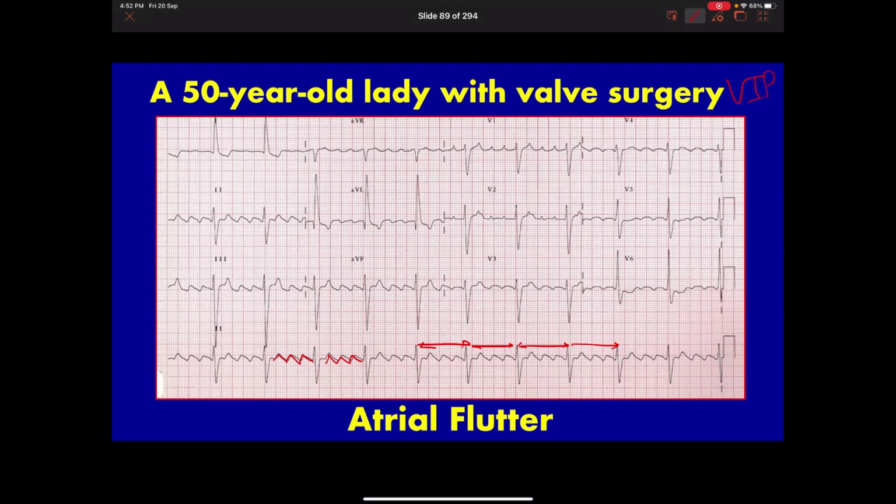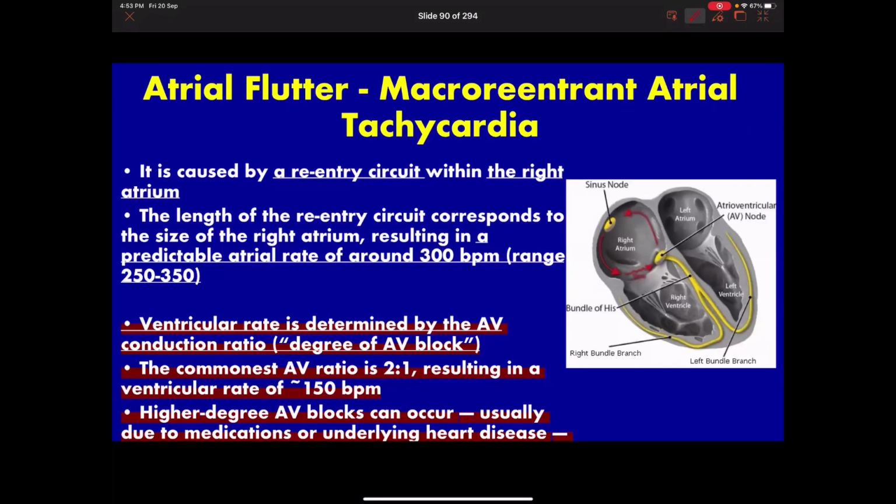And every 4 to 5 flutters, you get a ventricular contraction. You know, a full ventricular contraction. That's why you get atria, then ventricle, you know? So it is tachycardia because each of these is technically kind of like a heartbeat, you know what I mean? So this is tachycardia. Atrial flutter is very high yield. I saw this in many past exams.